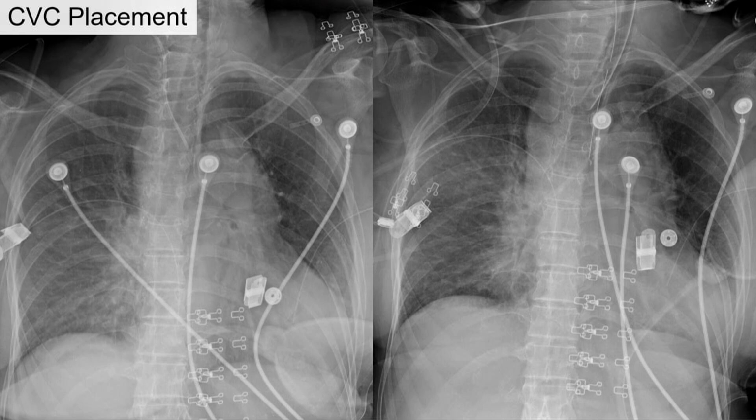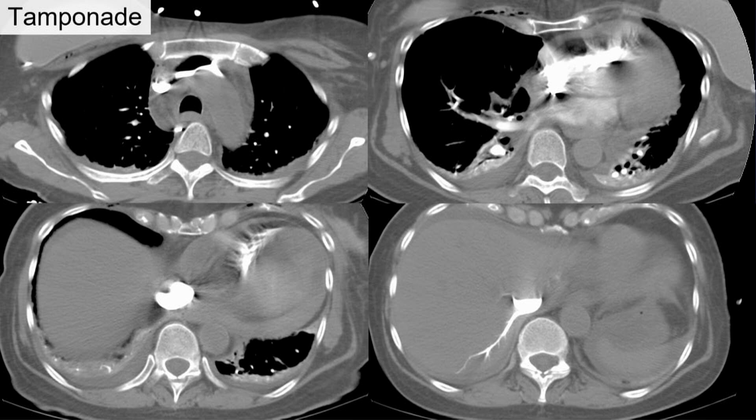It might be extravascular. So when they saw this, they instinctively said, well, this isn't going to work, and they pulled the catheter out. And the patient continued to do poorly. Their mediastinum is a little bit wider. This is about 30 minutes later. Brought the patient over for a CT scan. And on the CT scan, what you can see on the initial images, there's contrast, I should point out they were injecting from the left side. That's important. So the left-sided injection, not from the right.